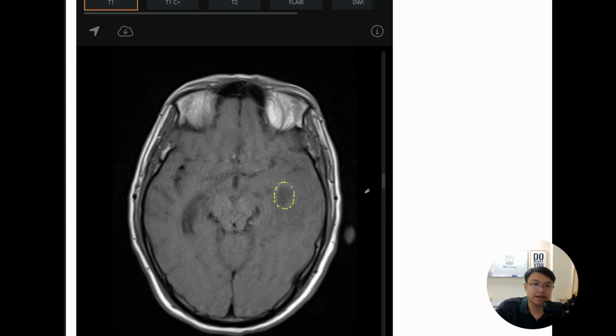Actually, this is a less commonly discussed point, okay, because if this is a pyogenic abscess, then the presence of paramagnetic substance from the neutrophil, okay, as the wall will give rise to this kind of T1 hyperintense signal. This may not be the best clue for you to make the diagnosis, but surely it is very nice supportive evidence, I would say, okay?